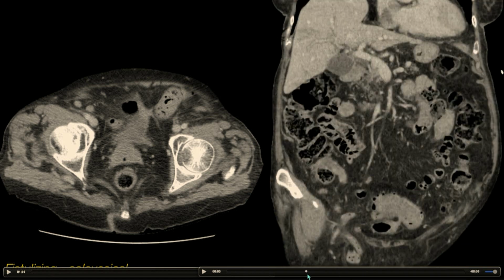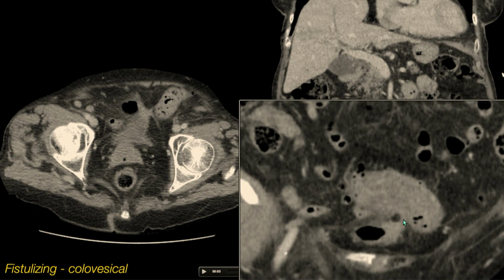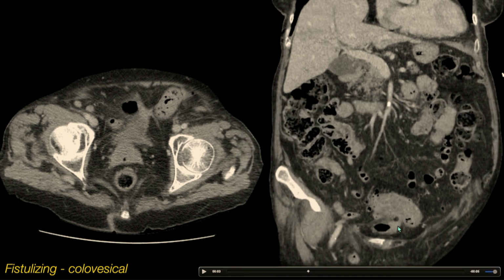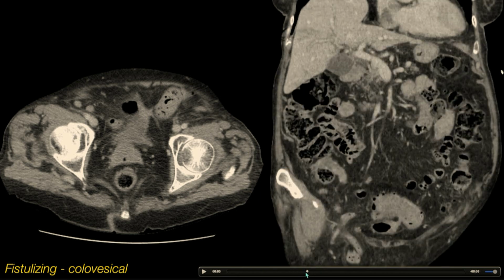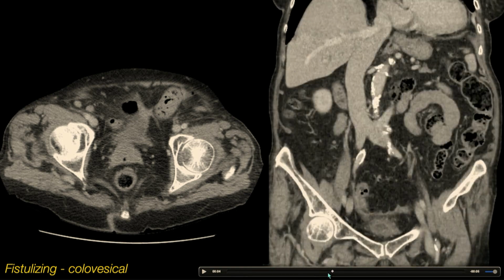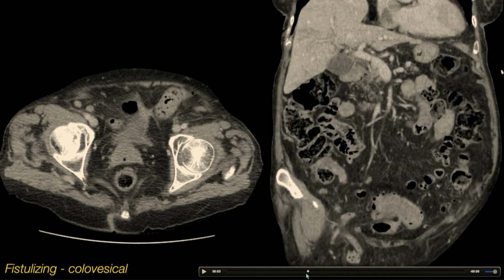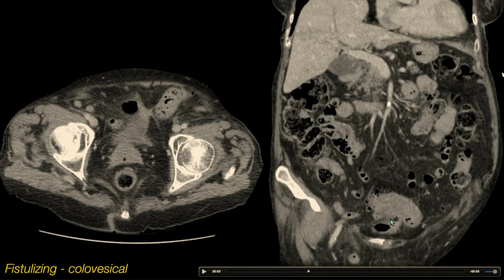There it is. So the other point, we showed a lot of those diverticular cases where there's a huge inflammatory mess. But sometimes when you're dealing with a fistula tract, just keep in mind they can be relatively small and understated as well, depending upon where you are in that setting of fistulous disease. But that thin channel of communication, even though relatively modest in appearance, is quite significant.